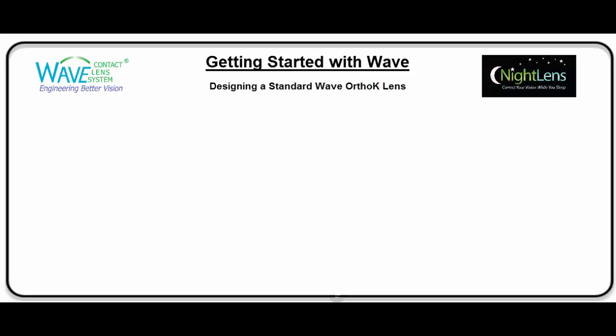If you are ready to move on, here's what we're going to cover next. After a brief introduction, I'll review qualitative and quantitative assessment of baseline topographies. Then I'll share some principles related to topography selection and reasons to reject specific topographic images. Following that will be manual editing and cleaning of captured images. And finally, extrapolation, measuring HVID, and evaluating the spherical offset map before designing the lens. This section of the video series will conclude with the actual design of a Wave OrthoK lens.